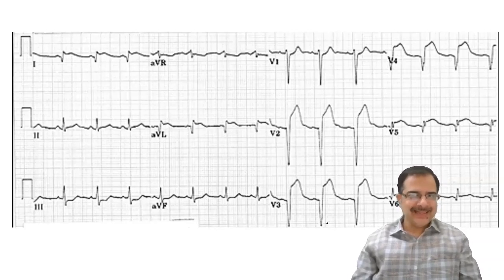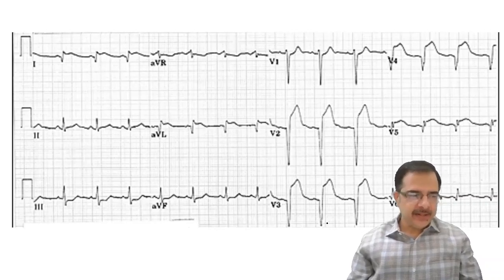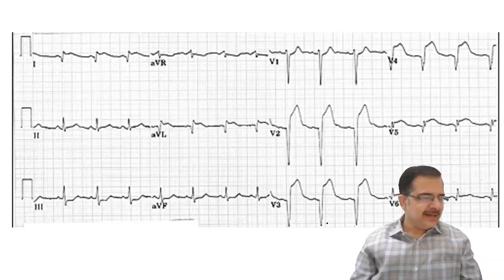Yes, this is an anterior wall MI, and is any other wall affected here?